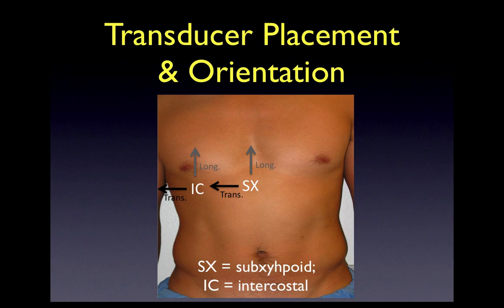One of the challenges sometimes clinicians face when performing a study with a subxiphoid approach is that some patients don't tolerate any transducer pressure in this area, particularly if they're presenting with abdominal pain. And lastly, there's a theoretical pitfall of the clinician providing excessive transducer pressure, which can actually produce a compression of the IVC and can make them think the patient has less intravascular volume than they actually do.